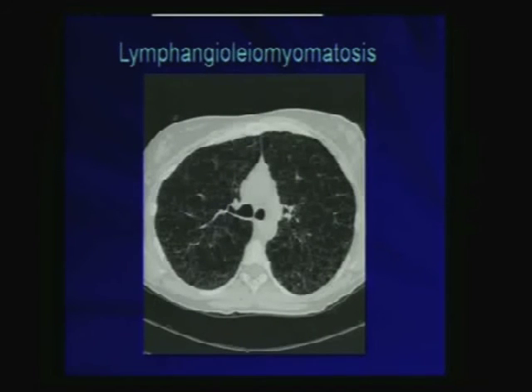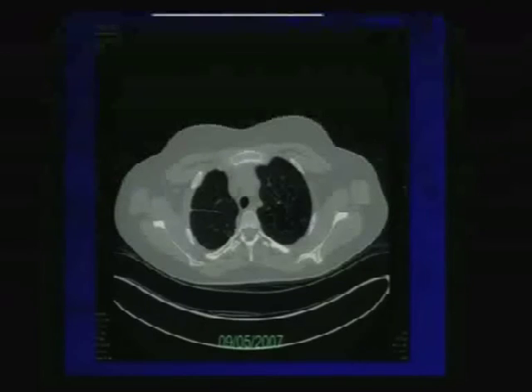This is just to contrast you in a patient that has diffuse cystic disease in comparison to the patient with pulmonary emphysema I showed you, either centrilobular emphysema or panemphysema. Look at the fact that the cysts are uniform, but they have a well-definable wall. You see there is this white line here that's surrounding all this area. So this is true cystic disease which does involve the secondary pulmonary lobule, but again, it does not have any kind of predilection for the secondary pulmonary lobule. More importantly, it does have a wall surrounding the areas of paucity.